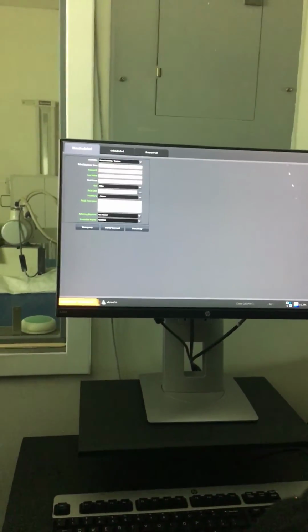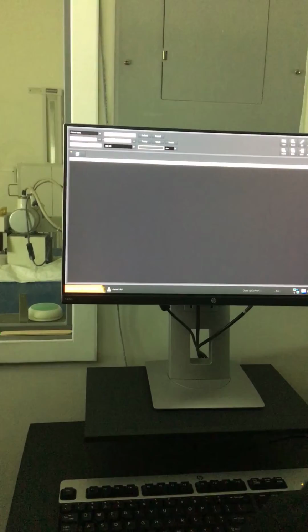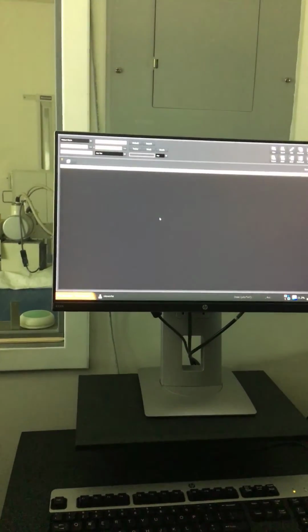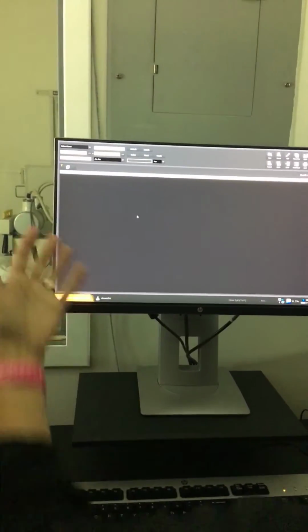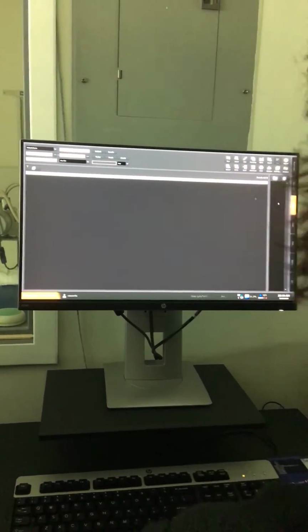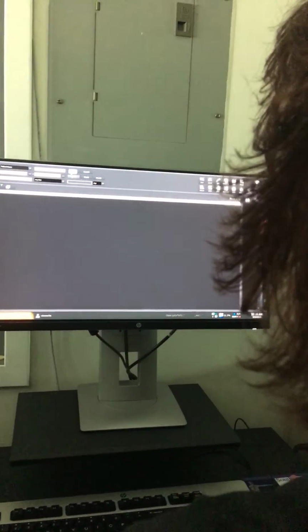And then it should go in the database. What did I say the name was? Oh, I didn't shoot anything. That's right. So when you go in that way and go out of it, you guys will go out and annotate later. This is where you would go when you're in that same screen. You're just going to go to database and you can search it by your last name. And then it comes up, and that's when you're annotating it.